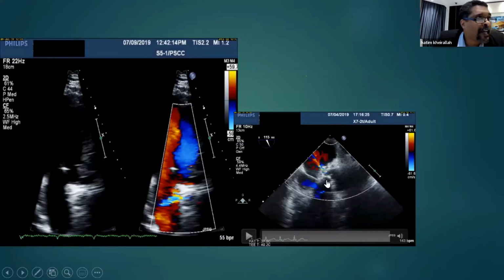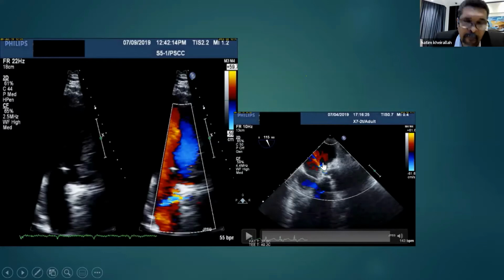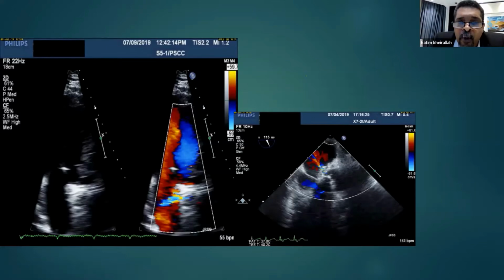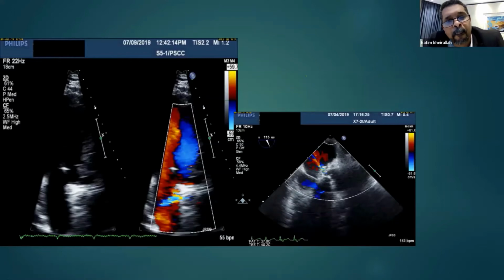But here, I don't see any aneurysmal dilatation. In fact, I see thickening here, and this is a sign of abscess formation, phlegmon, collection, okay? So when you see this one here, like this, then it becomes necrotic with cavitation and echolucency. That's an abscess formation with fistula. But if it's aneurysm only, sinus aneurysm, you will see that there is a dilatation of the aneurysm, okay? And then a rupture. That's the difference between the two, okay?